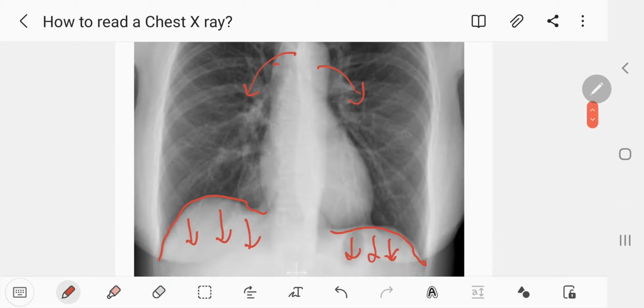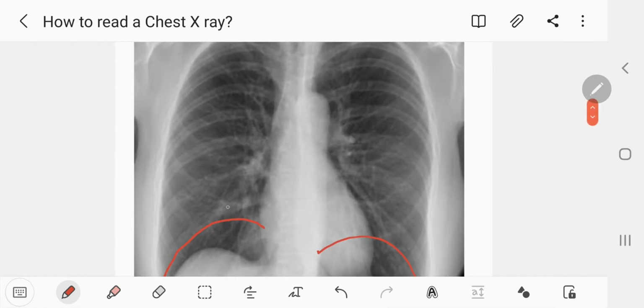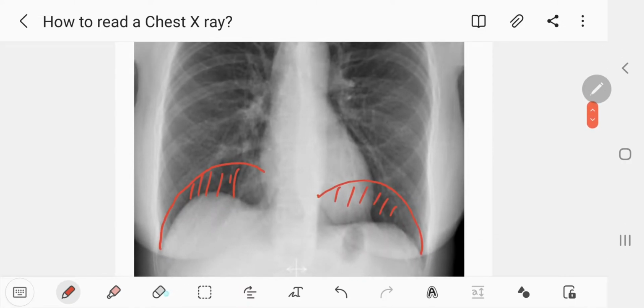I hope that makes sense, because if you see the patient in an expiration phase, this dome of the diaphragm will be moved more upwards, and this area of the lung will be obscured. If you can't see this area, it's difficult for you to identify what's the problem without having a view of the complete x-ray of the lung. Okay, so I hope that makes sense.